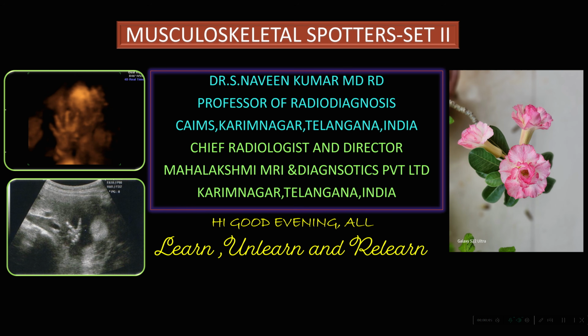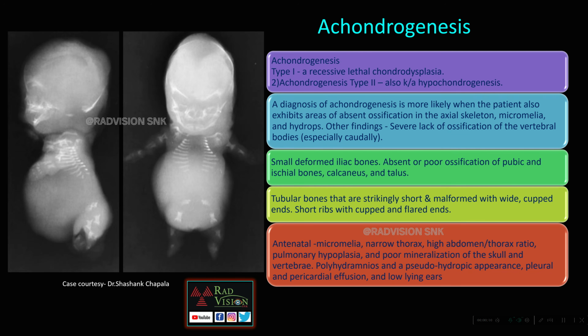We will try to discuss a few interesting musculoskeletal spotters. So this is the first case. This was a stillborn baby.